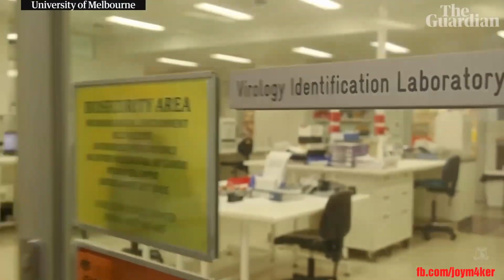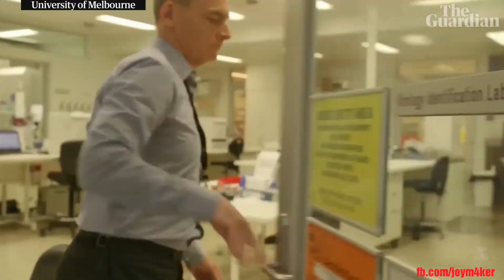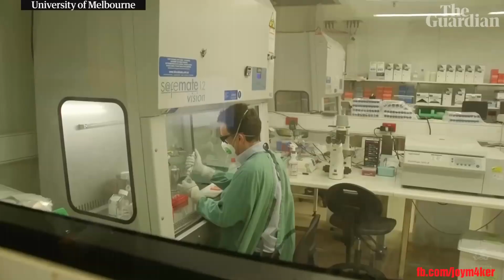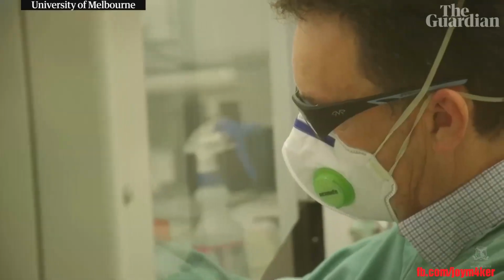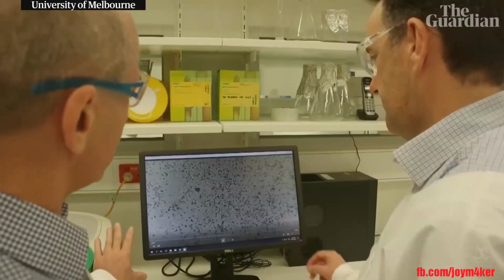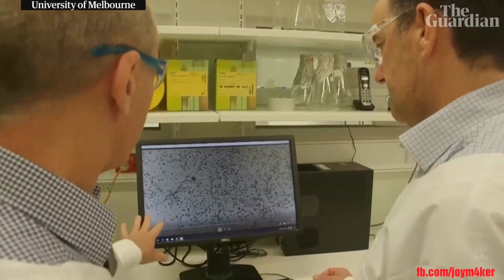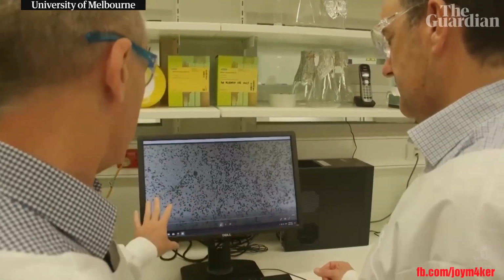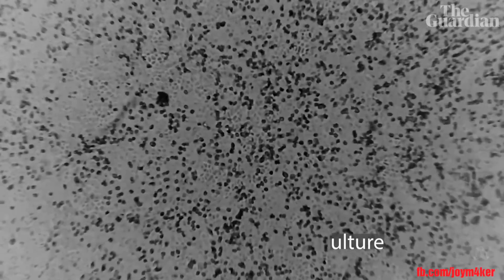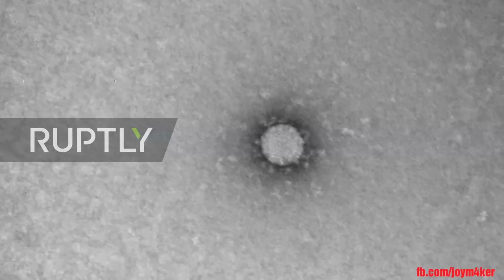The very first thing we're doing, which we're doing today, is to get genetic material extracted from the virus in the hands of public health labs in the various state jurisdictions, so they've got a positive control for their laboratory tests. We've got a sheet of human cells, virus growing in it very evenly across it, and then the next thing we do is to then ampule up the virus itself.